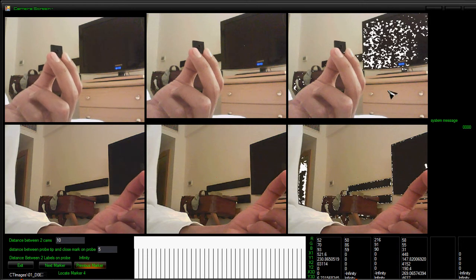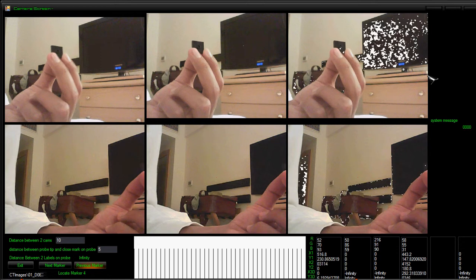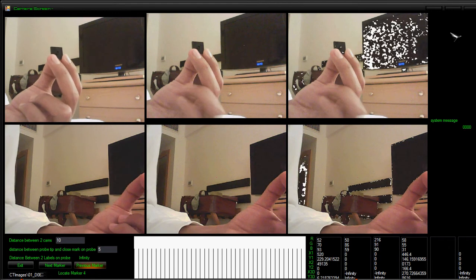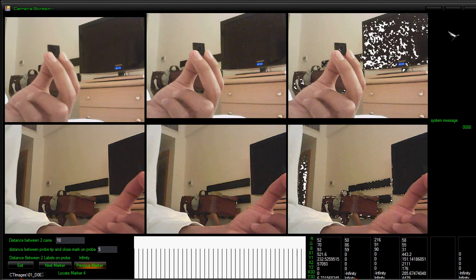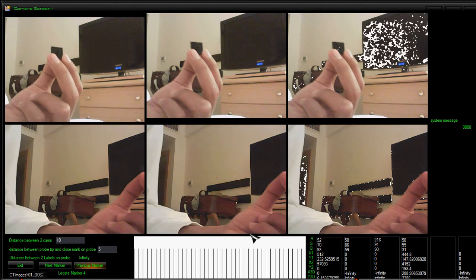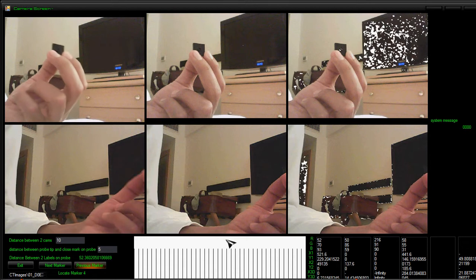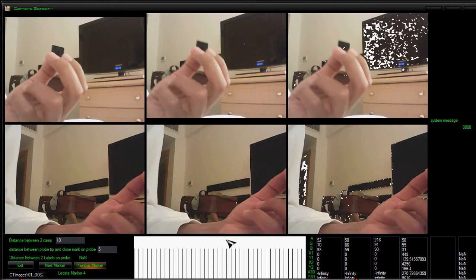So let's say I want to know if my probe cuts the CT scans, it's gonna appear here. But let's say I'm above the CT scans and I just want to know where I'm going. In here will appear not where you are in the CT scan, but where you are going to penetrate. It's like above the CT scan.